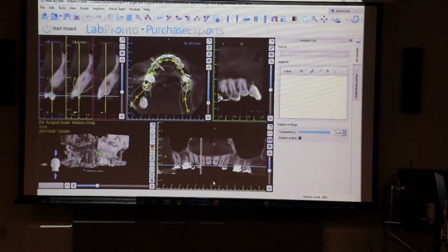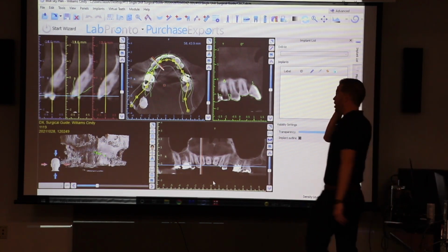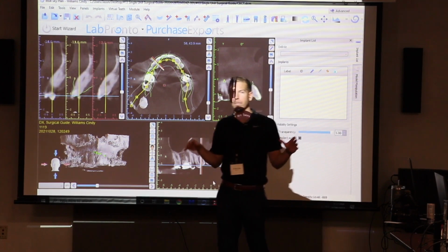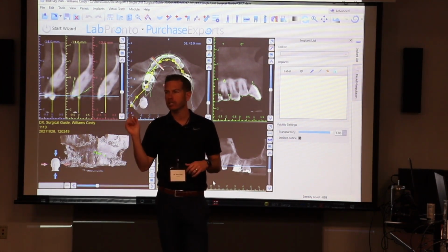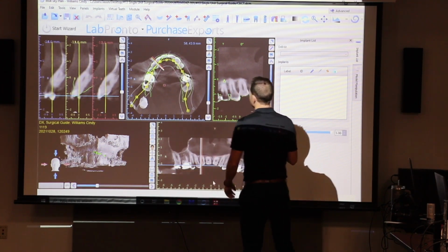We're still doing our setup. Every time we open the software, it's kind of nice just to get all the windows set up into a consistent fashion that you're really used to, because if it's always changing, it gets confusing. Like, wait, I used to have a button over here, now that button's gone. So let's break up a couple different quick topics here.